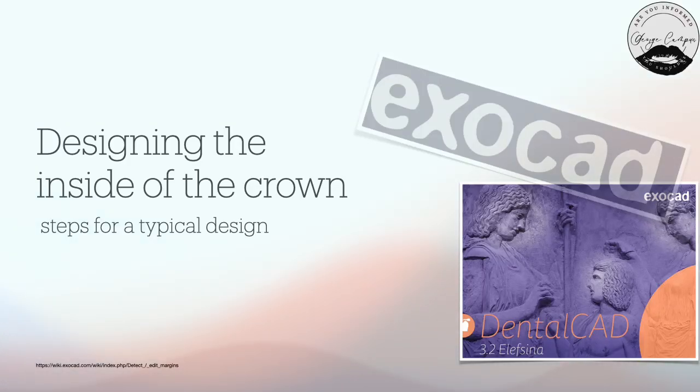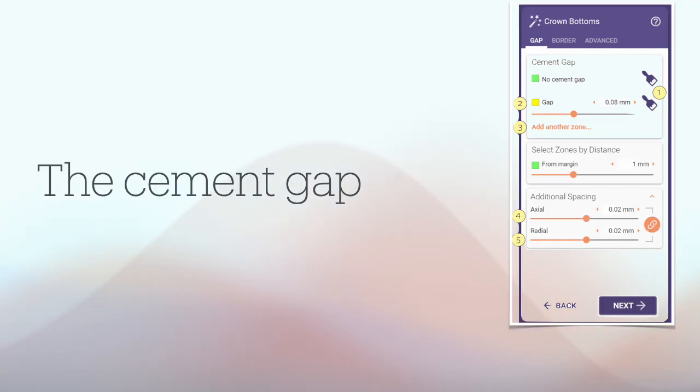Hello everyone. This step covers the design of the inside of the crown inlay, the part that will be in contact with the preparations. This part of the construction and the parameters involved are crucial for proper fitting. In case you are not happy with the fitting of the produced part, it's here where you should look for possible parameter changes. The cement gap.